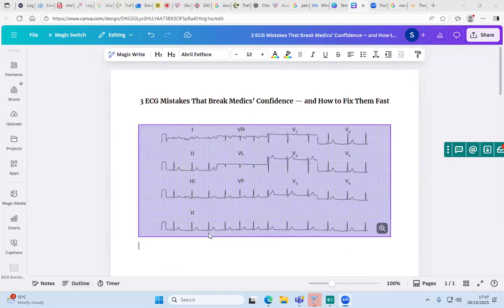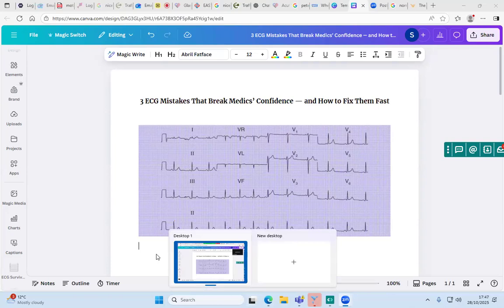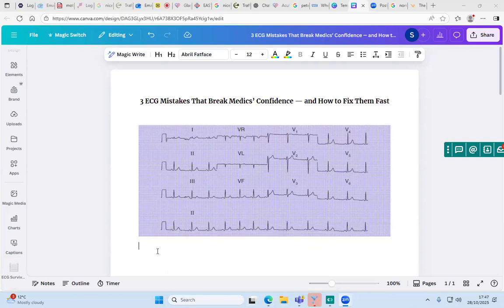Then what am I checking for next? The regularity. Now there are 4 big squares here, but when I go to the latter part of this ECG, it looks more extended, about 5, if I'm correct. But bearing that in mind, the PR interval looks the same across all beats. So I know this V2, V3 sort of looks off, but when you look at it as well, there's a P wave followed by a QRS wave, and it reproduces the kind of prolongation that we are finding in the later part of the segment. So basically, this is a sinus rhythm with a normal heart rate.